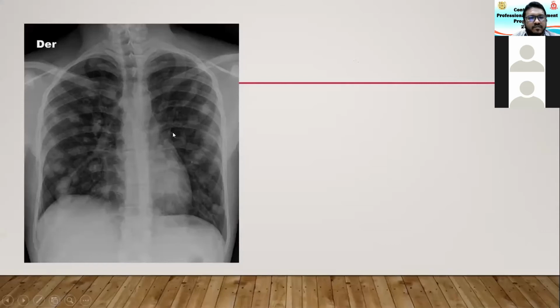This is common. There are a few primaries, especially bone tumors, that you will end up with like this, and you have to immediately think about what is happening, whether the patient has a known primary, or if it is the first presentation, then you have to look for a primary of any kind to explain the pulmonary metastasis. So make sure that when it comes to pulmonary metastasis, they are well defined, usually peripheral, and lower zone predilection is the usual scenario for pulmonary mets.